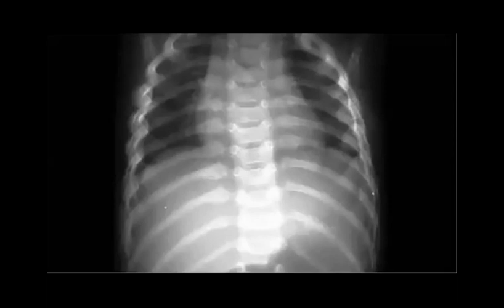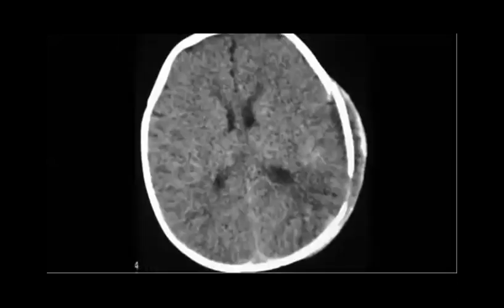So a highly specific fracture, either metaphyseal or rib fracture, or maybe something like SSS: scapula, sternum, spinous process. Then if you did a CT brain and you find this one, again it will be child abuse. What do you see here? Can you describe it?